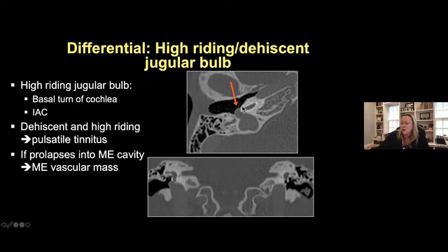And so you want to make sure that whatever lesion you're looking at is not contiguous with the jugular foramen. And you also then want to look at the bony margins. If it's clean margins and not a permeative appearance, it's most likely a venous diverticulum. Or if it's a permeative bony erosion around that lesion, then you might suggest the possibility of a glomus tumor. So those are the kind of things that can help you differentiate, and certainly MR can help as well.